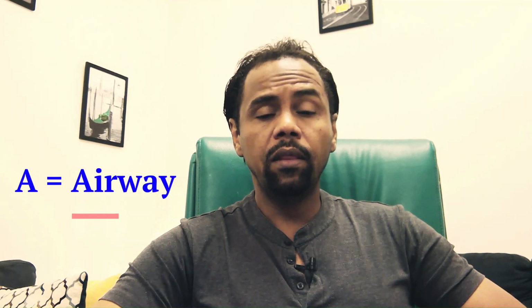In the chest X-ray especially, you are going to check the airway. Is it central or not? We are speaking about the trachea and the main bronchi here. Then you are going to check the B, the bones, and they also give you an idea about the quality and the symmetry of that X-ray. C, you are going to look for the cardiac shadow. Is it enlarged, or is it within normal range?